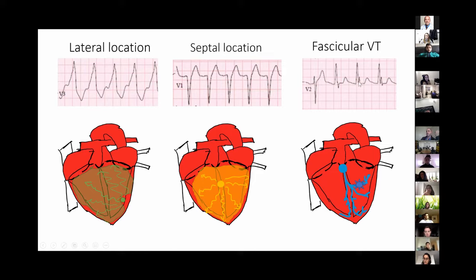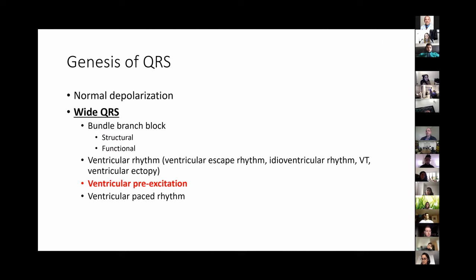So that's going to be your narrowest ventricular tachycardia, and it can be very deceiving in the sense that you might think it's a supraventricular rhythm. But again, this is not to be exhaustive of how to localize where the PVC is coming from. It's just to illustrate the concept that just based on the width of the QRS, you can always immediately get a sense: are you dealing with something starting more from the septum or more from the lateral wall?